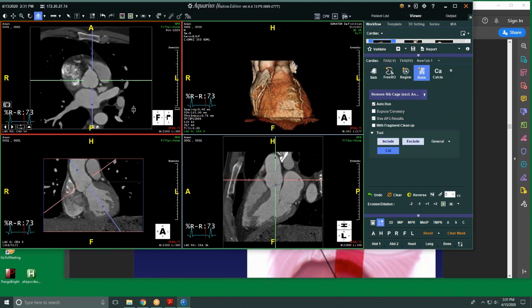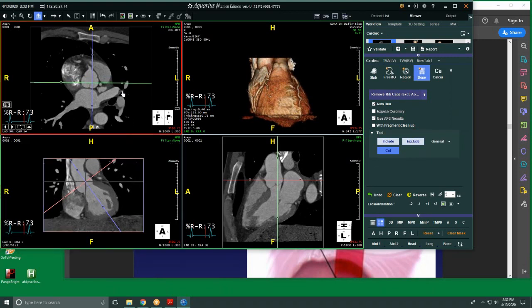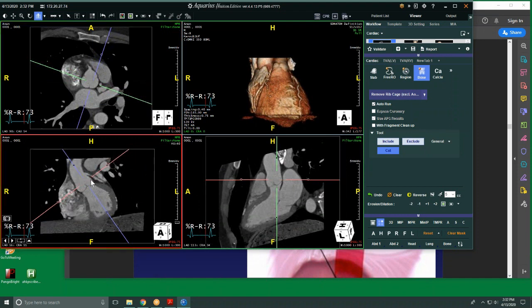And so you'll notice the normal is to have your coronary arteries originate off of the sinuses of Valsalva. Interestingly, this patient here is very normal, except for one thing, okay? His left coronary artery originates above, right at the sinotubular junction, above the left coronary sinus. Abnormal, but otherwise this is a very normal study.